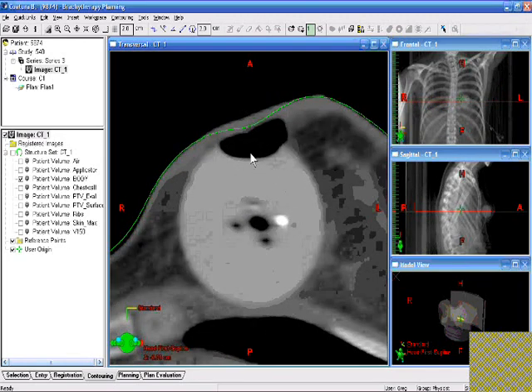So what would happen as a result of this is that we're going to be generating a lot of structures that are affected by where the skin contour is, and so that can make a number of things wrong. Remember that last time we calculated an external volume here called the skin max.